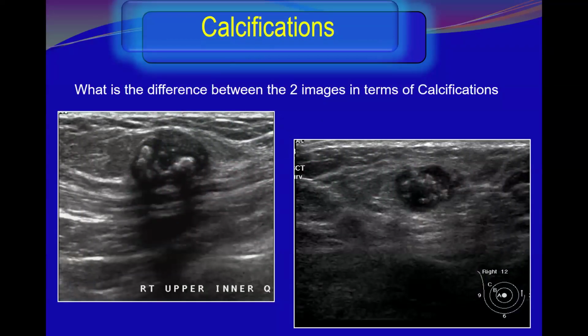What is the difference between the two images in terms of calcifications? Regarding the calcifications, what is the difference in these two examples? No one? There is no difference between these two calcifications?